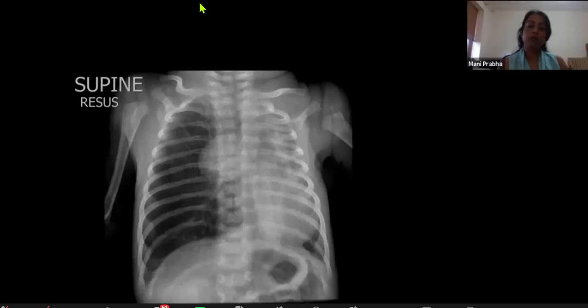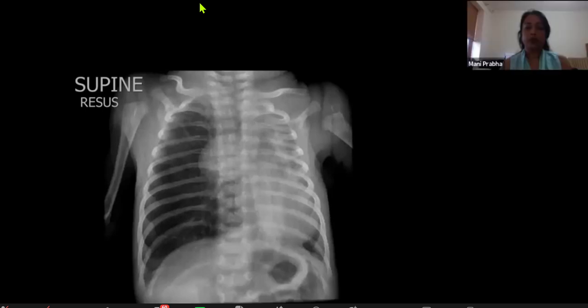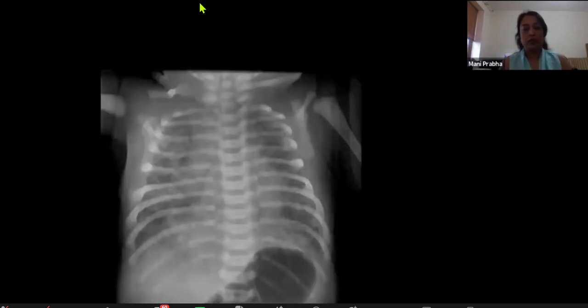Okay, mediastinal. Unfortunately the picture's a bit fuzzy, but I can see a normal looking right thymic contour. The left thymic contour is not very well displayed, but I think there might be underlying abnormalities in the adjacent lung. Overall, the mediastinum looks to be slightly shifted to the left. Okay. Yeah, lovely. We'll discuss it slightly later. Yeah, this one.